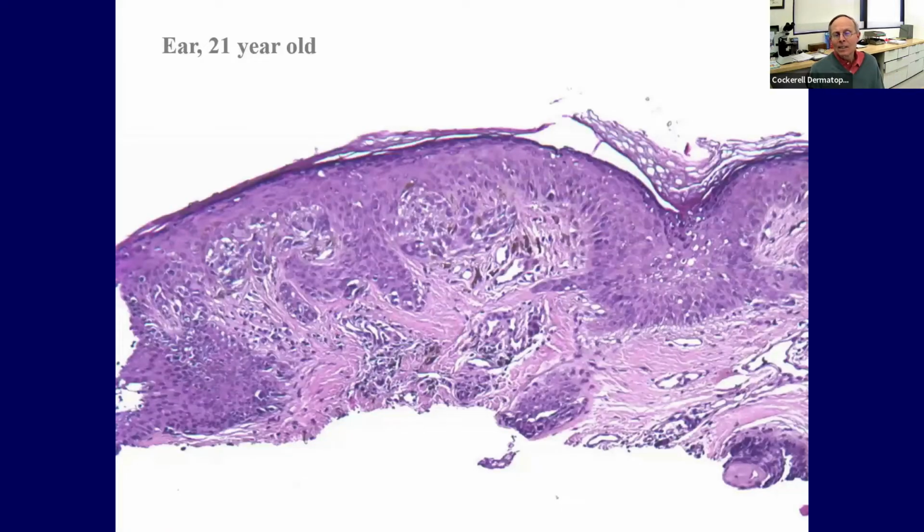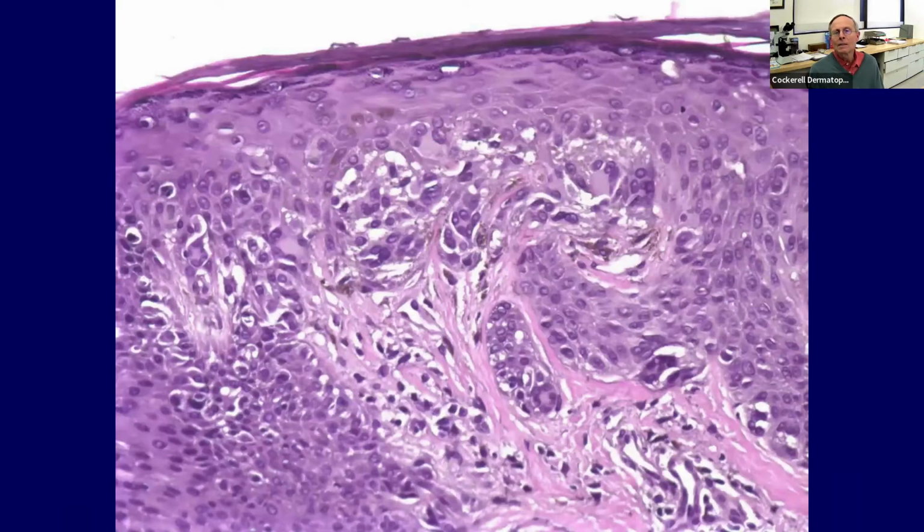It actually, classically, these lesions kind of look spitzoid. They have these epithelioid melanocytes. They're often spindle. You may get a little bit of pagetoid spread. And this was not a melanoma. It was signed out as a melanoma, and the patient did fine. It was just conservatively excised and never really had any problems with it.